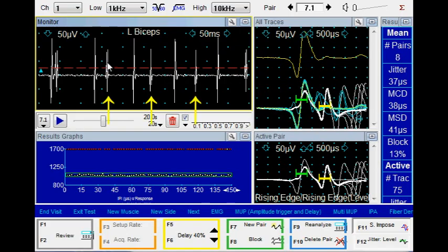And then we have an action potential pair, which is the smaller amplitude spike seen over here, here, or here, and we can also see it over here. So this is what we call a technical interference, which may look like blocking, because sometimes we see an action potential pair and sometimes we see only one spike.